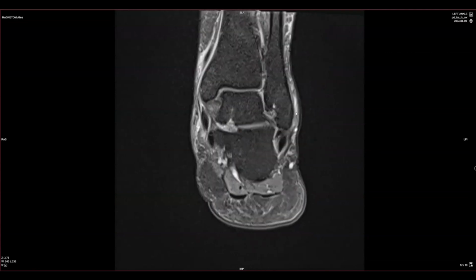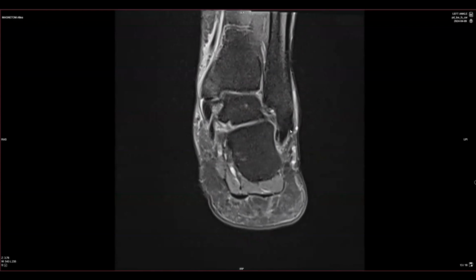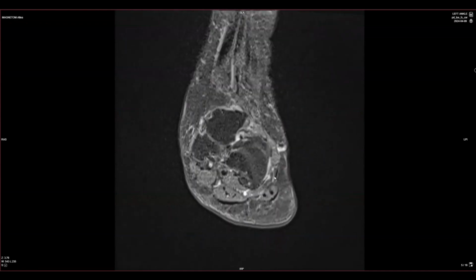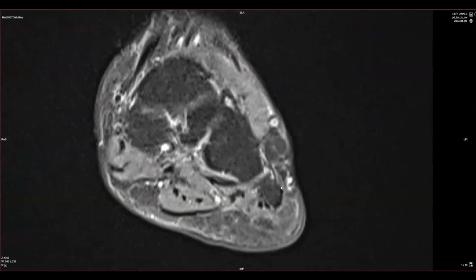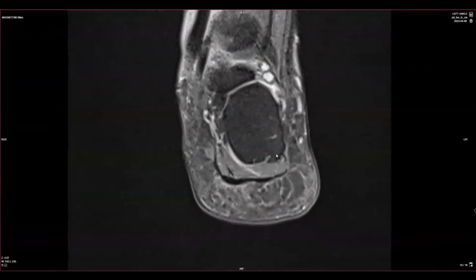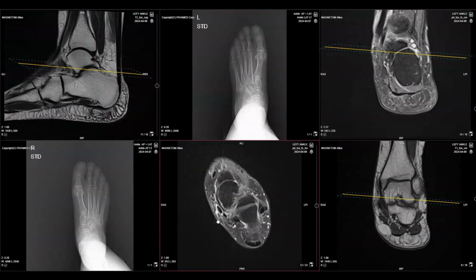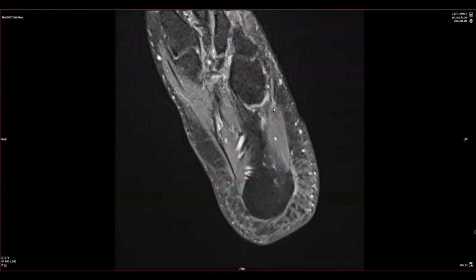You're seeing the swelling here, and you want to keep looking at it in multiple projections to train your eye. But I'm looking at the two pieces of the peroneus brevis, the longus in the middle. The brevis will come back, never quite makes it back together. Again, we can see the two portions of the peroneus brevis. Moving back to the axial images and appreciating the superior peroneal retinaculum and the tenosynovitis distally and the peroneus longus.